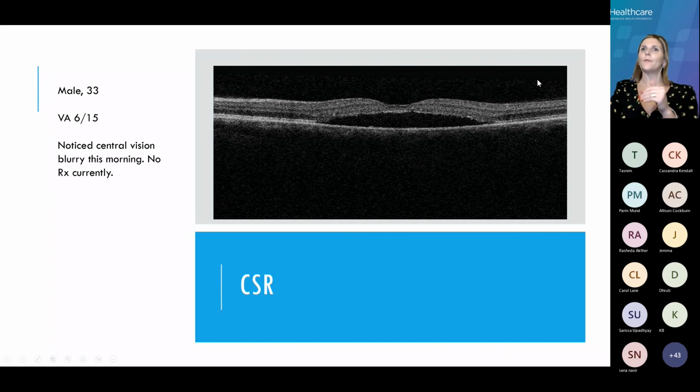So our profile, if we're looking at our posterior hyaloid layer, all normal, we can see we've got our normal foveal depression. Our intraretina, from ILM to ELM, is all intact. And remember, go to a point where it's intact and follow with your finger or your mouse, then work out the area that you're looking at. So this is an area of subretinal fluid. Remembering CSR, this is quite a clean CSR.